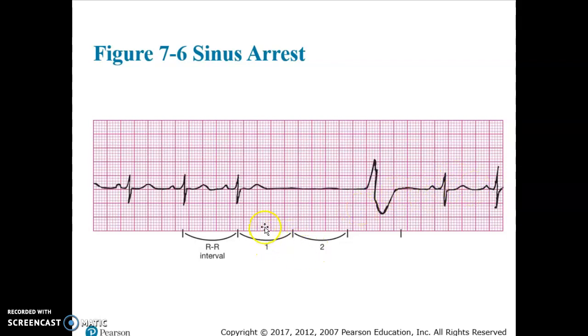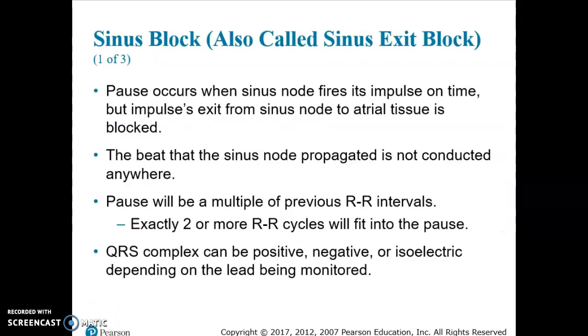When we talk about the pause exceeding the RR intervals, what we mean, as I said earlier, is two of these sections. We have our RR interval, and we have two or more sections without any activity that are the same length as this RR interval. If that doesn't make sense, please get with me and I'll explain that to you.